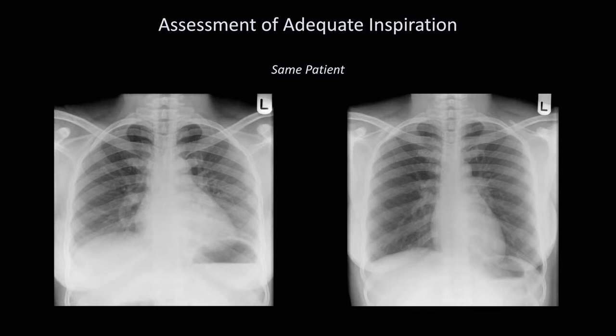a poor inspiratory effort. I remember a patient from my residency who once had several years of serial chest x-rays, every one of which had been interpreted as poor inspiratory effort, before he was ultimately diagnosed with restrictive lung disease based on pulmonary function testing. Had those x-rays instead been interpreted as low lung volumes, which would have been more appropriate, the diagnosis may have been made sooner.